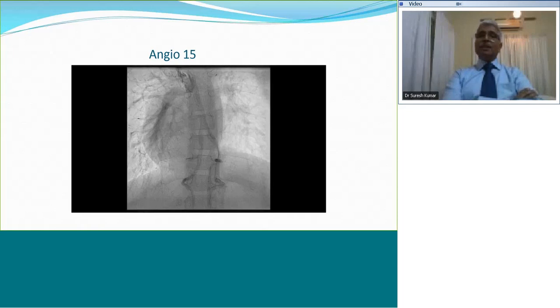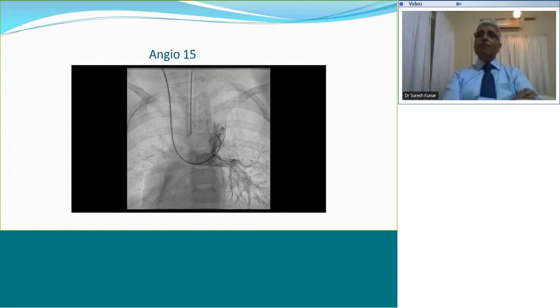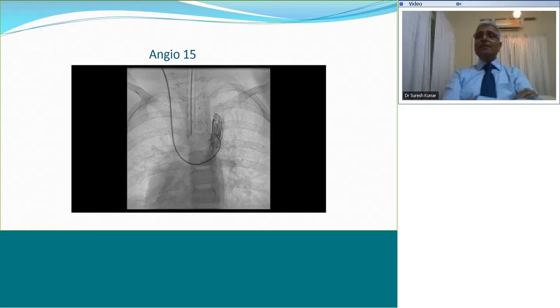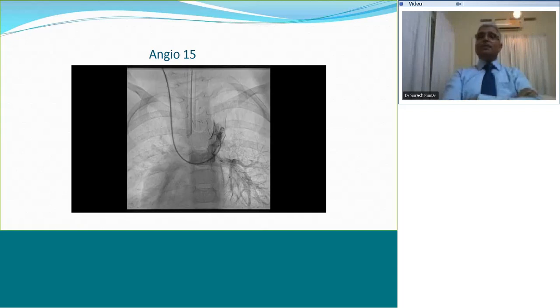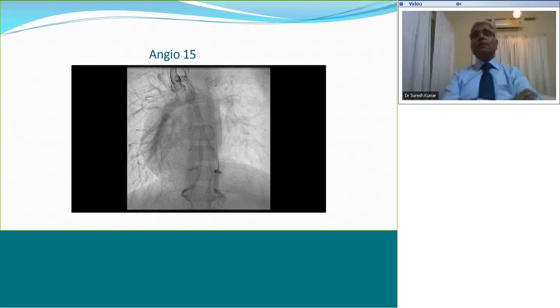Yes, it's a bidirectional Glenn with a decompressing vein. Can you describe that bidirectional Glenn a little more? I agree, Bhargavi. It's a Glenn angio and veno-venous collaterals, but you must also tell me something about that bidirectional Glenn. Is it the routine garden variety of bidirectional Glenn, or is there something more than that? It's bilateral BDG. Very good. Non-pulsatile is a guess because we don't really know whether there is some antegrade flow or not. That's a different matter. But it's not the non-pulsatile part. You should be able to describe it as a bilateral BDG.